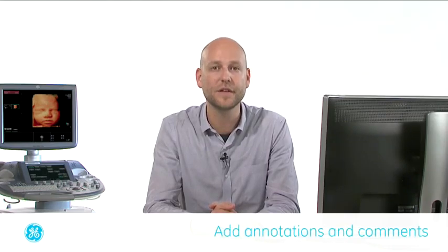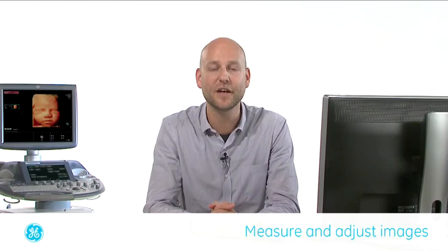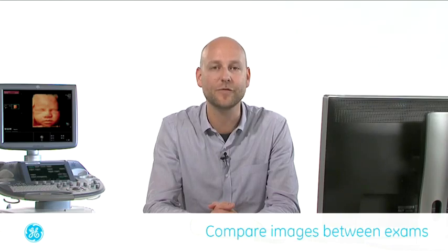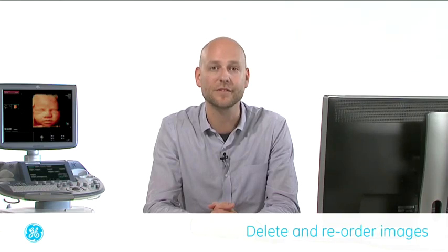Welcome to the Viewpoint 6 Image Gallery video guide. The goal of this video guide is to show you how to use the features of the image gallery, including how to review images, add annotations and comments, measure and adjust images, work with 4D view, create secondary captures, compare images between exams, and finally, delete and reorder images.